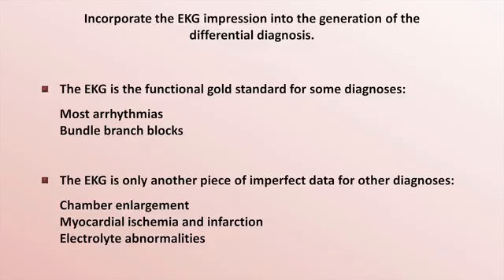Even when the EKG shows a finding that is certain and unambiguous, such as atrial fibrillation, it still isn't usually a final diagnosis, as the clinician next needs to ask what other condition led to those cardiac abnormalities. For example, there is usually some explanation for AFib, such as chronic hypertension or acute heart failure or drug intoxication. EKG abnormalities don't develop in isolation. They always require some explanation.